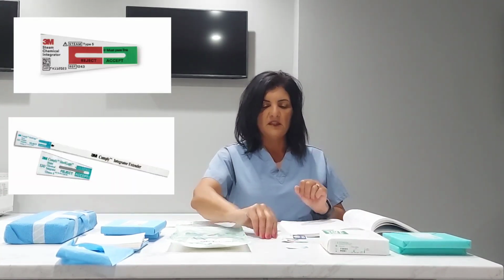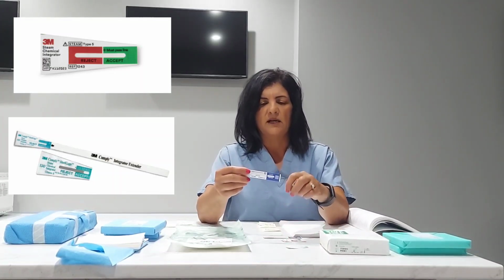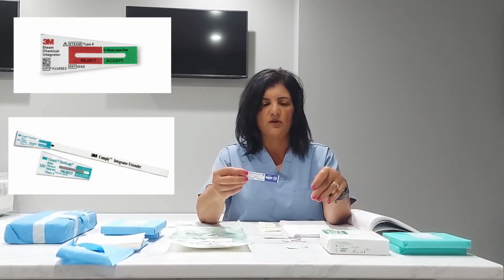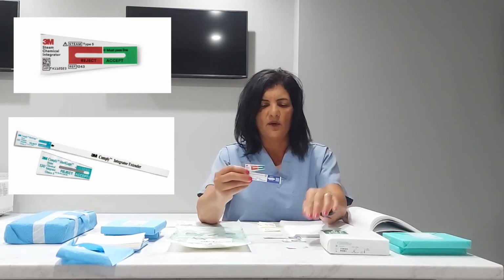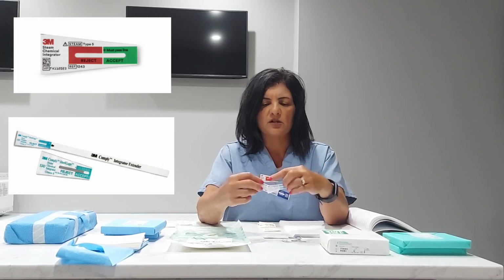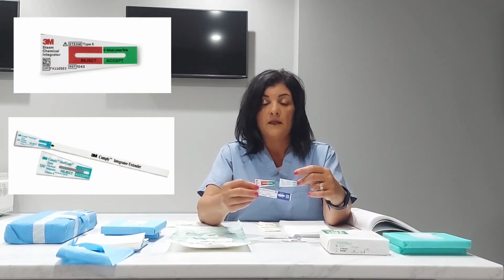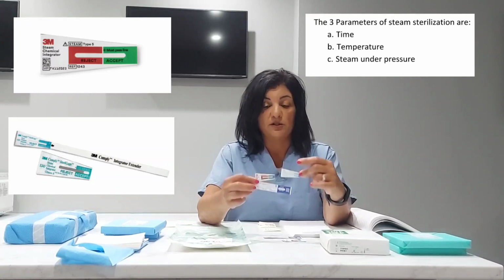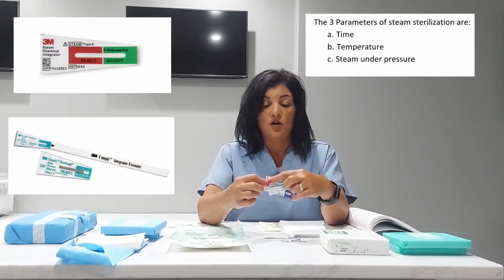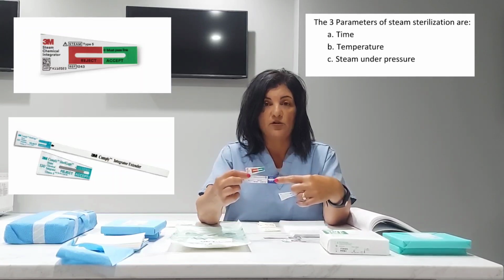So that kind of got ahead of myself, but the type 5 indicator, there's several brands on the market. There's this one, some of them have tails so that you can find them. There's this green and red one, there's this blue and white one. They're pretty much a window. Once it's been exposed to the time, temperature, steam under pressure, these windows will go from white to black, and it has to go all the way across into the acceptable range.